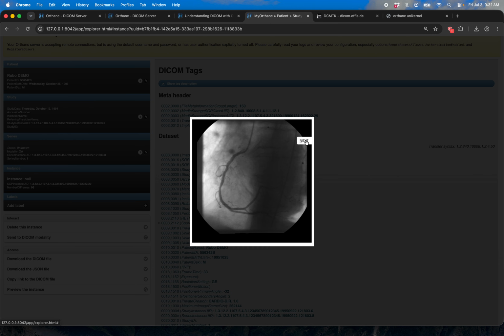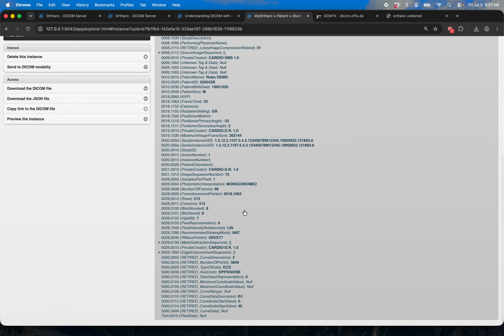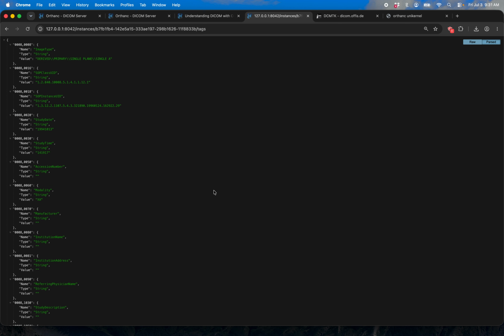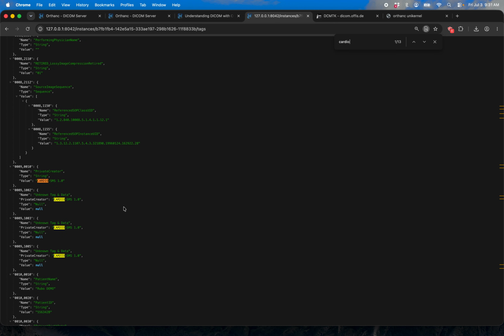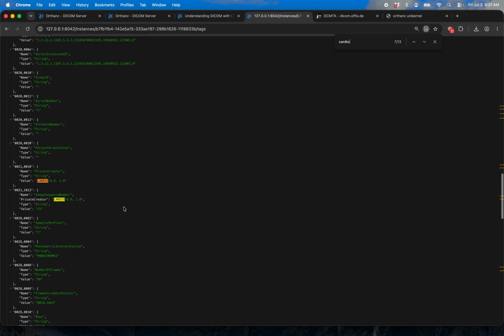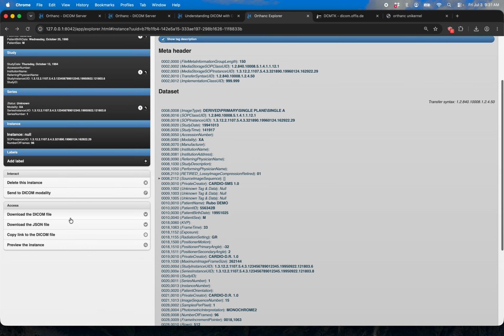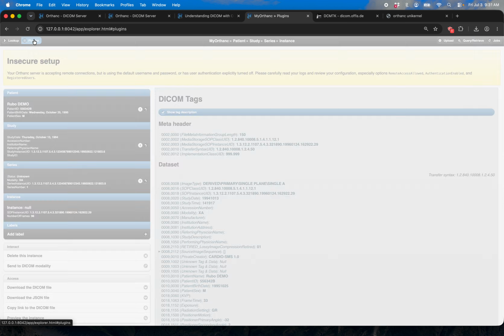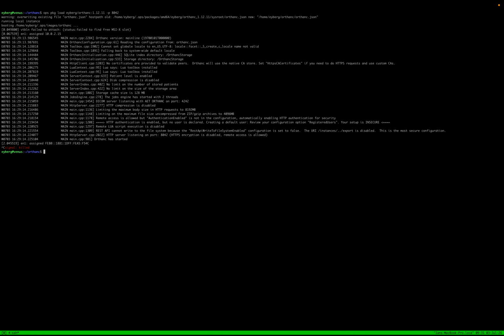Interesting. So when we talk about metadata, this is the type of metadata that's getting included in here, right? And we can even see the JSON here. If you're more of a data person, we can extract that out and get everything. So there's cardio related stuff here, and all sorts of stuff. You can send it, you can download it, and obviously all the various plugins and stuff. So it's pretty basic, right?